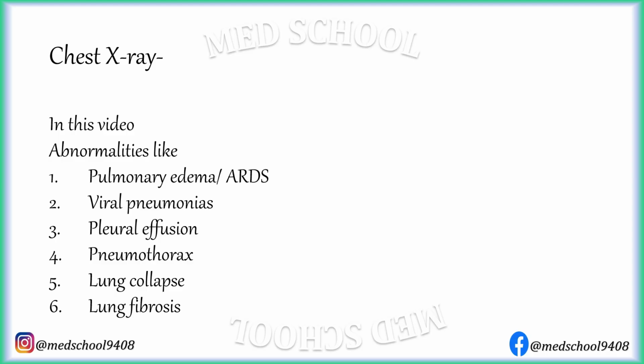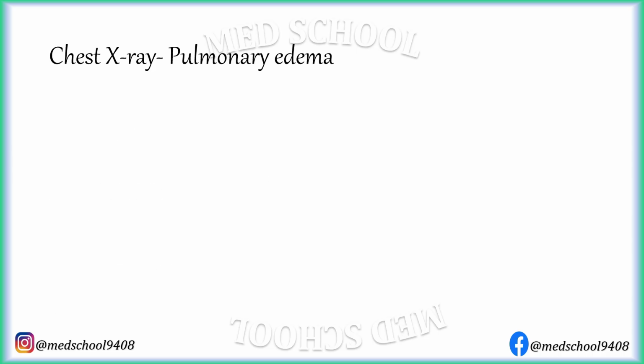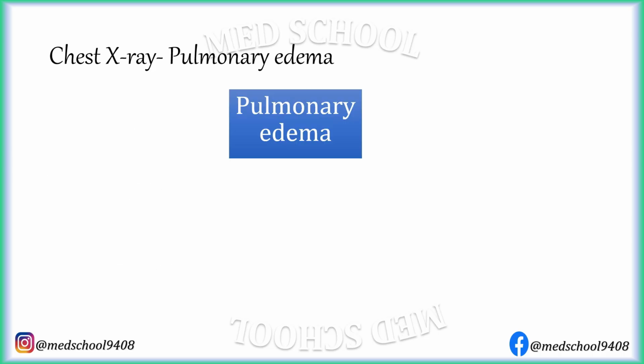In this video, chest x-ray findings of abnormalities like pulmonary edema or ARDS, viral pneumonias, pleural effusion, pneumothorax, lung collapse and lung fibrosis will be discussed. The first topic of this video is pulmonary edema.